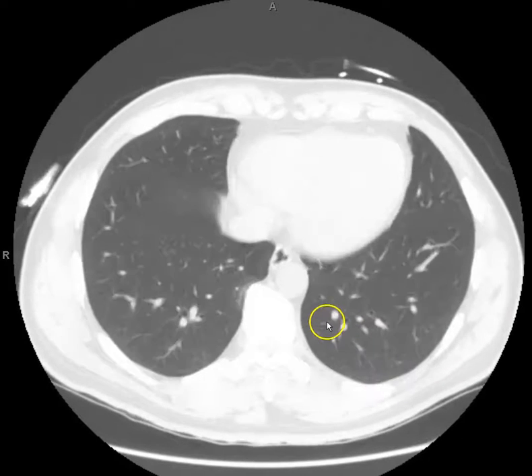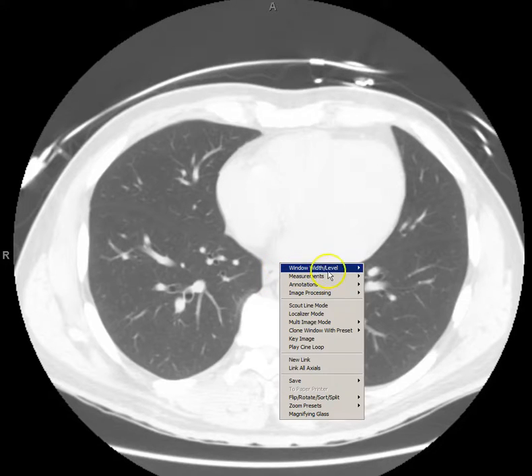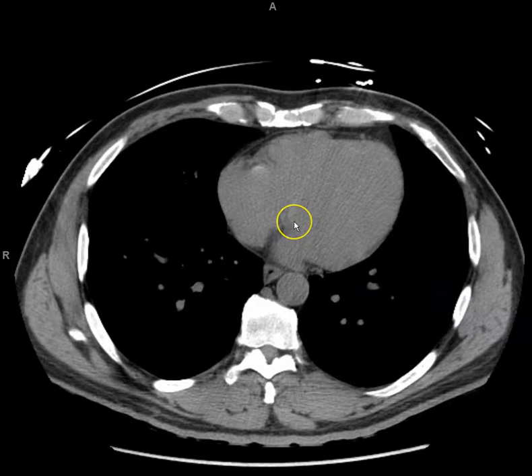So, as you see, this unfortunately doesn't go high enough to get the pulmonary hilum in the picture or the trachea. The trachea is already bifurcated here. It's a little bit higher up, but when you do see it, it's in front of the esophagus.